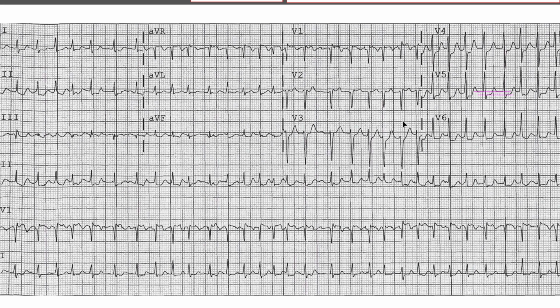So sometimes you will have sinus tachycardia, and during the tachycardia you will have some sort of ST depression. Now, what needs to happen is this heart rate needs to go down. And when the heart rate goes down, if this ST depression is still present, if it doesn't go away, then you have a problem. Then you have ST depression in V4, V5, and V6.